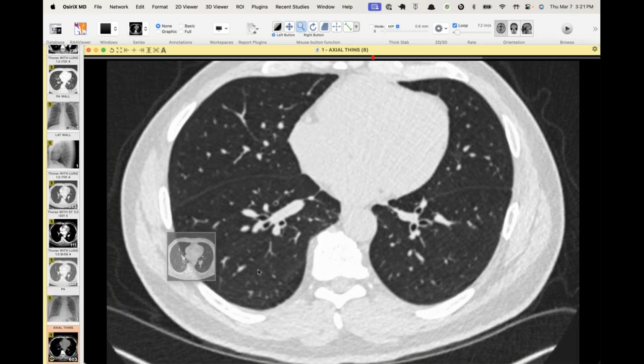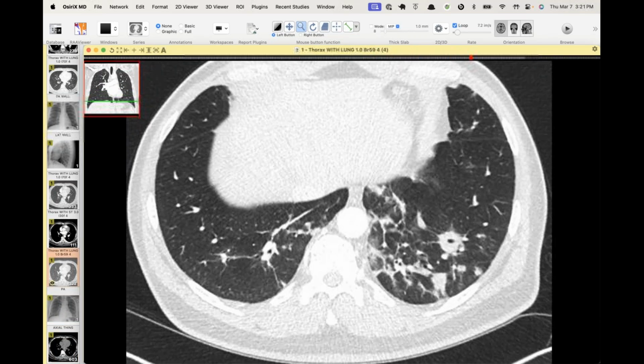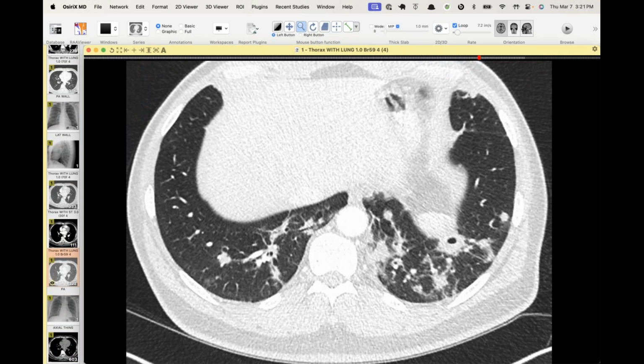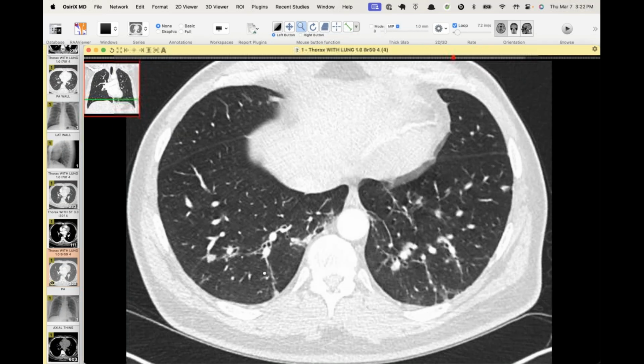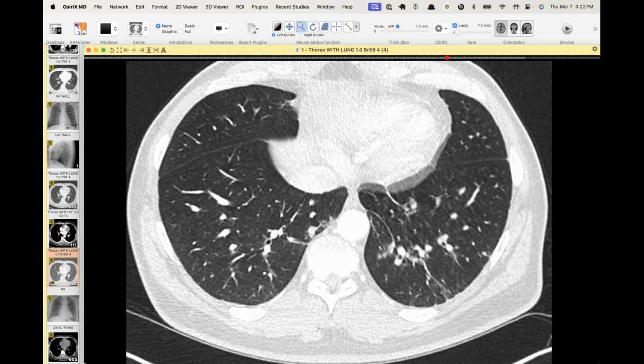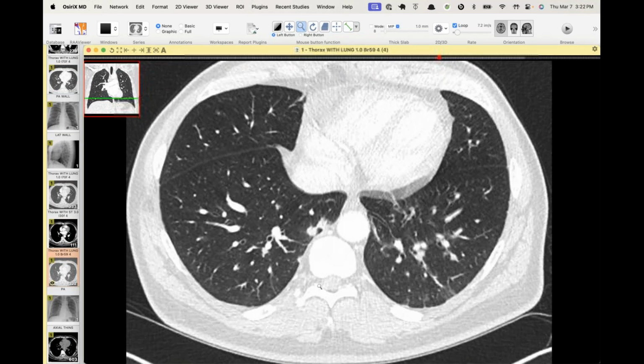Any thoughts? Multi-systemic process. Cavitations. Yeah, it's kind of weird, right? It's just kind of these migratory things, just some organizing pneumonia, it looks like, in between there. IgG4. Does he have skin or brain lesions? Yeah. So he had bilateral optic neuritis. He had some other neurologic symptoms. And it was one of the tests in the CSF, between that and his optic findings, that prompted a treatment.